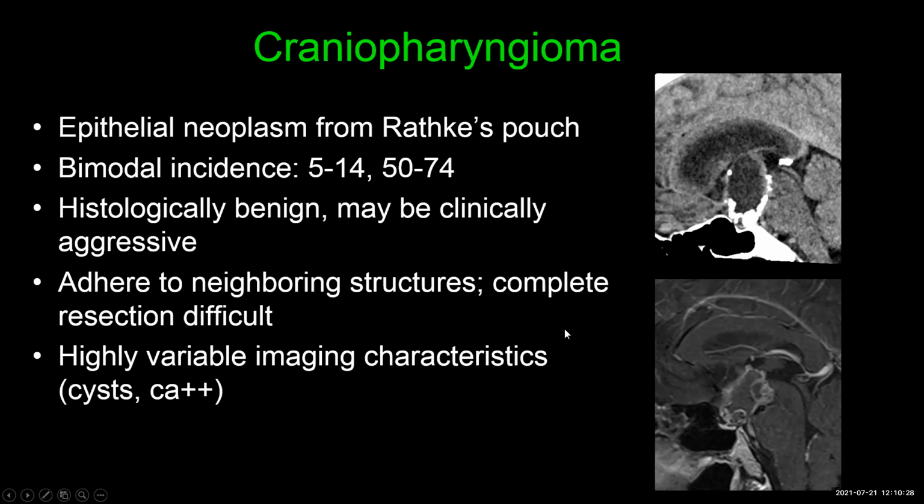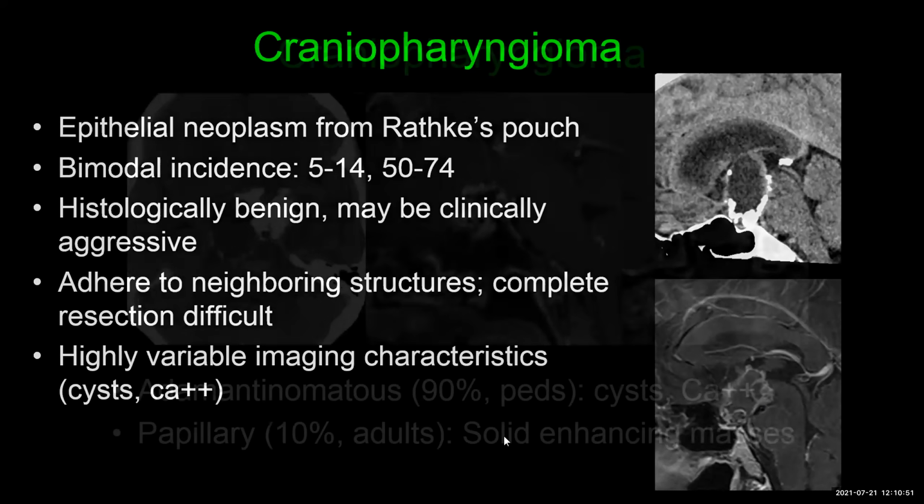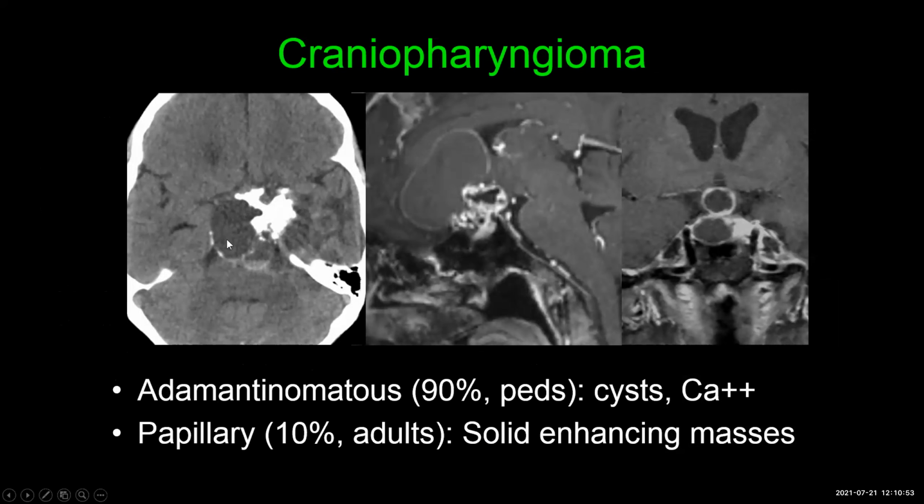The interesting thing about these tumors on imaging is that they can just sort of look like anything. They are often very bizarre looking. This is a CT image, and we can see a low density structure that looks like a cyst with all sorts of coarse calcification around its periphery in the suprasellar cistern. This is an MRI image. Portions of this are really not enhancing. Portions of it are enhancing like little nodules. So these are, again, different, very bizarre looking craniopharyngiomas in children.